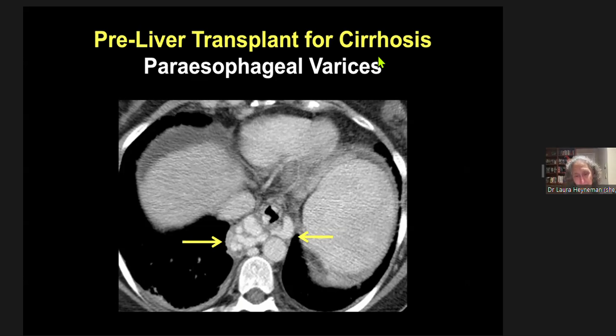But I picked up that there's an abnormality first because I'm seeing something to the right of the spine on a frontal film. This portion of the posterior mediastinum would be projecting to the right of the spine, which is not usually seen.